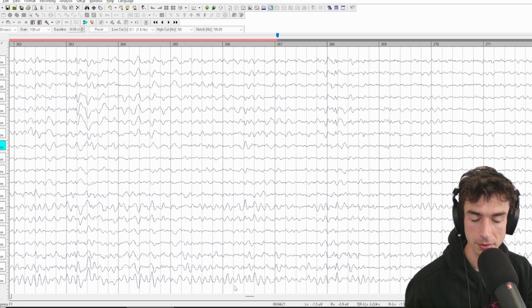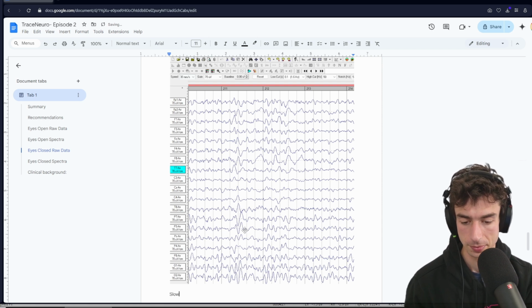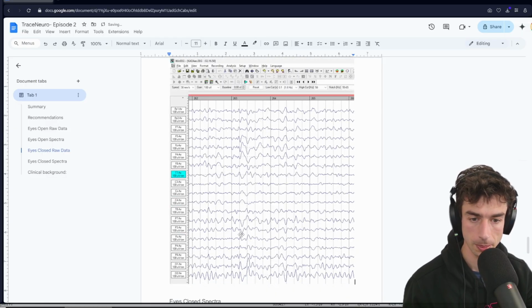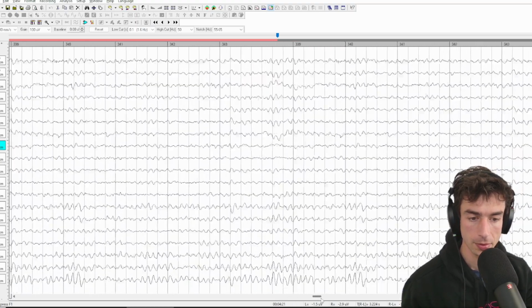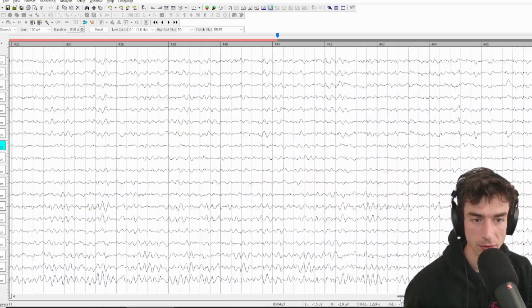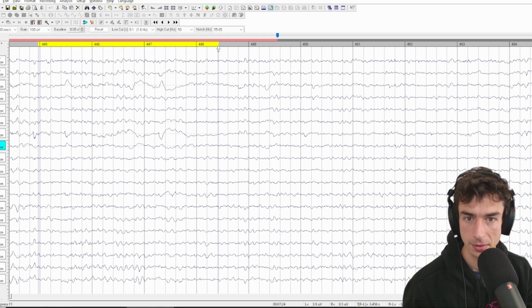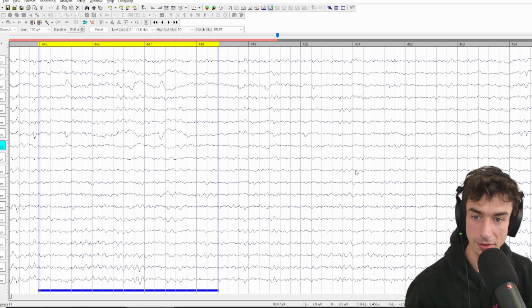So let's pull this out. And that may be all we need for our little report that we're throwing together. Could remove that little fragment of lateral eye activity.